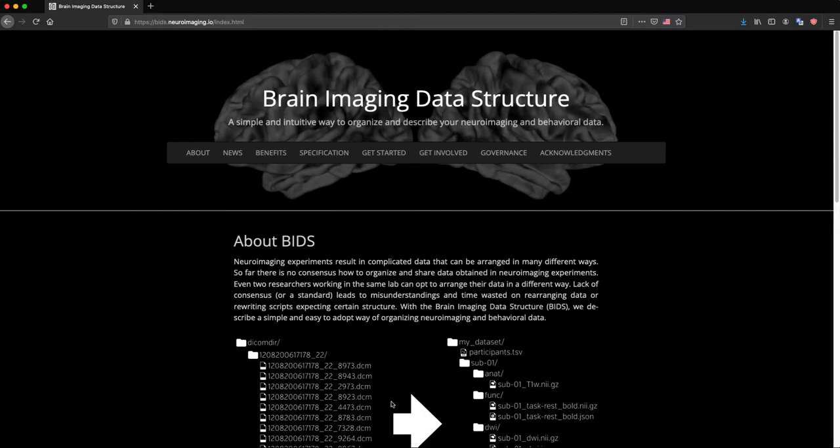Walkthrough tutorial on BIDS Lead-DBS. We have now implemented a BIDSified version of Lead-DBS, which means that the way the data is organized and accessed in Lead-DBS will change. The main goal of this tutorial is to acquaint you with the new changes and also show how you can use your old dataset with the new version of Lead-DBS.